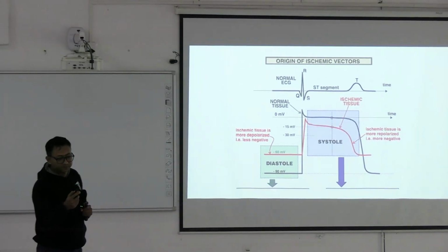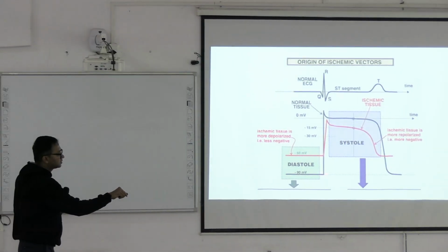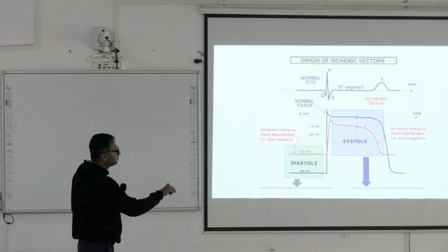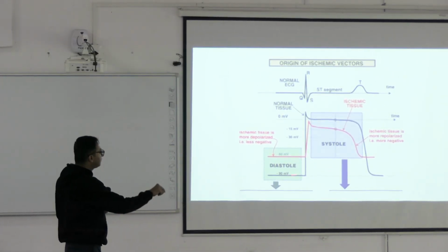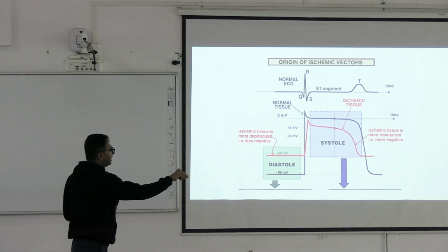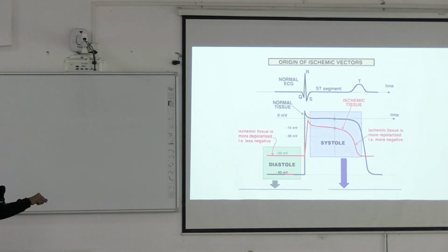Yes, very nice. Okay. So see, this one is phase what? Yes, diastole. Which phase is this? Phase 4. This is phase 4, right? This is phase 0. This small one is phase 1. Then this plateau is phase 2, right? This is phase 3 and again phase 4. Clear? Sit down.